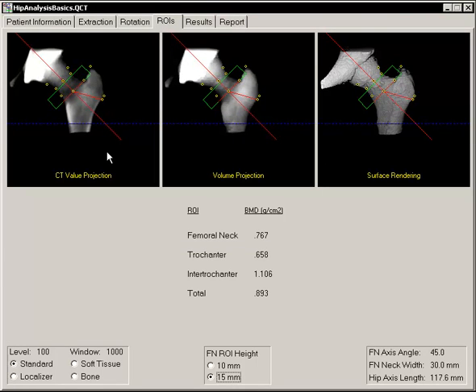The ROIs reflect the quality of the scan, isolation, and rotation. If everything is right, the chances are good you will not need to make any adjustments. If the ROIs are flawed, you can make adjustments, but you should also attempt to understand the cause to facilitate learning CTXA. We will now describe proper ROIs and demonstrate how to make adjustments.